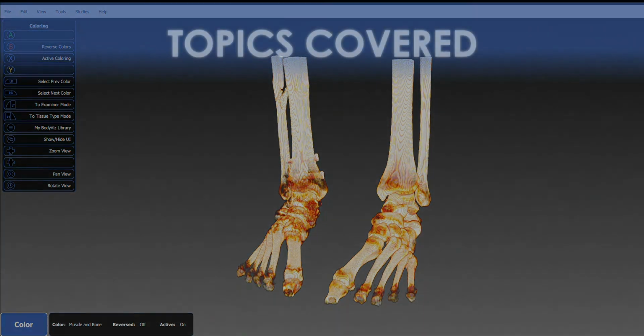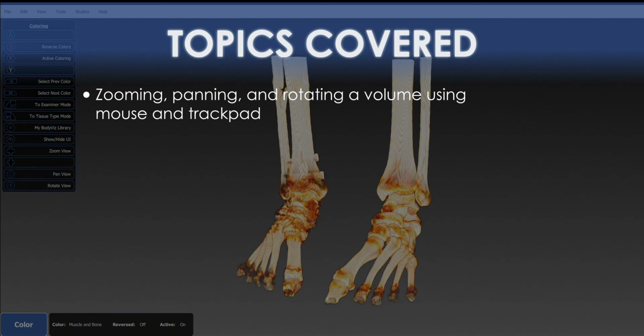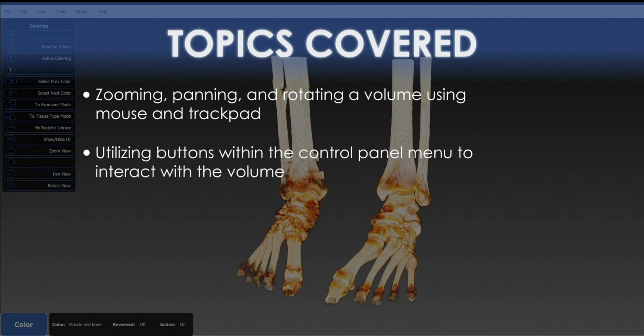The topics we covered in this video include zooming, panning, and rotating a volume using a mouse and/or trackpad, utilizing buttons within the control panel menu to interact with the volume, and changing modes.